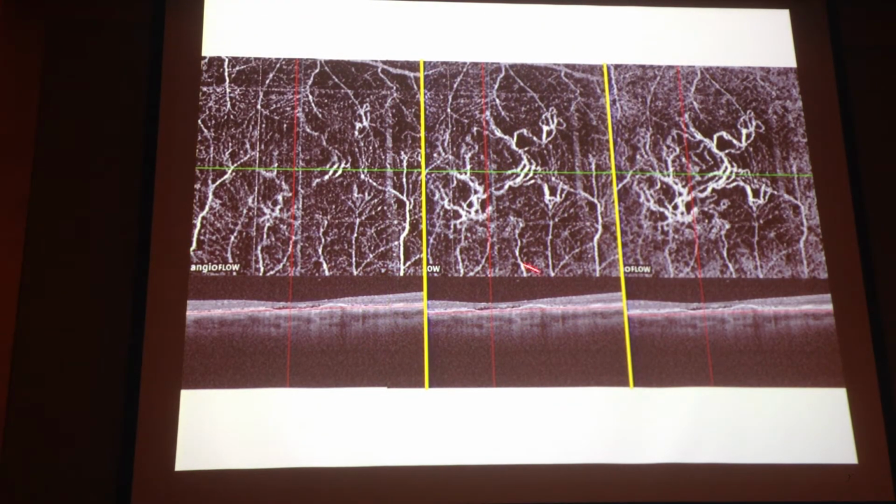But just to summarize, if you look at 1, 2, and 3, and you, for example, take this image, and then you go back, and you say, wow, the treatment was very effective, but in fact, it's just moving your slab a little bit.